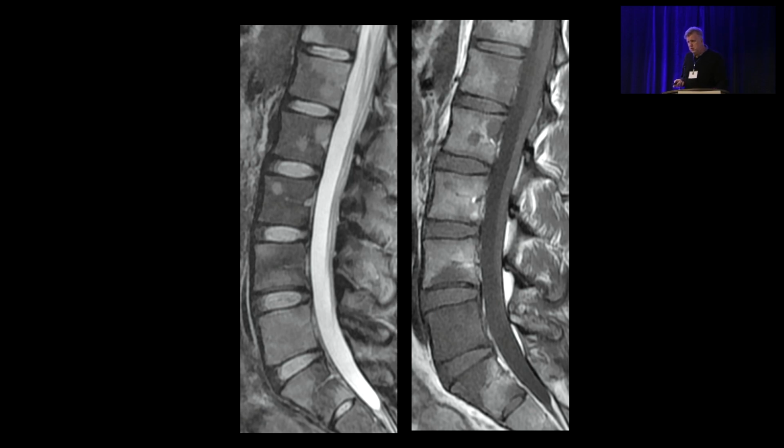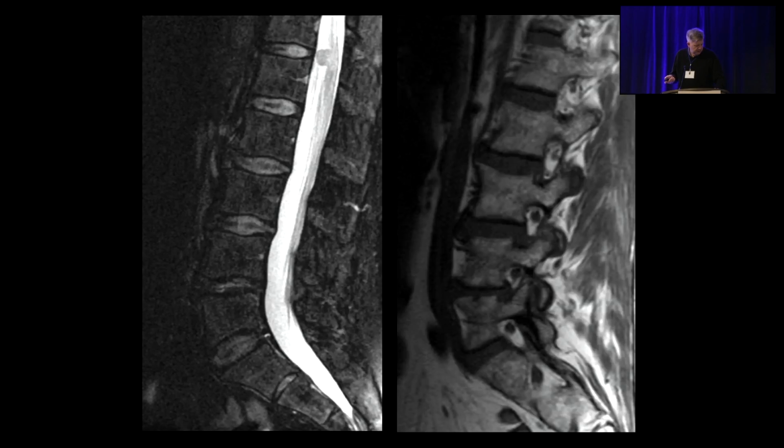So I'm just going to go through a few examples of patients that I happened to see over the years who ended up getting an MRI scan and had one of these other, serious conditions. This was a 28-year-old gentleman who came in with classic mechanical low back pain after a snowboarding injury. I told him, don't worry about it, 6 weeks, you're going to be fine. He wasn't fine. So we got an MRI scan, and he had lymphoma, which ended up being treated with a bone marrow transplant, and he did reasonably well, at least the last time I knew what happened to him.